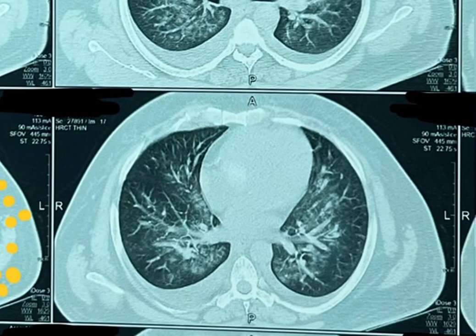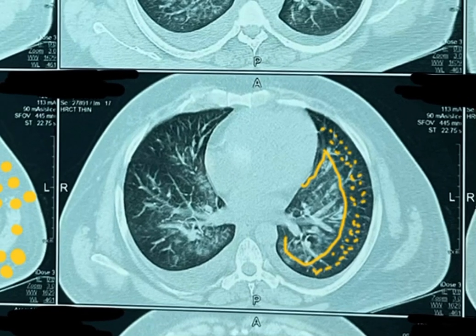Here also, what we can see, compare, we can clearly segregate this area. So this much is much radiolucent, means we can very nicely clearly say air, and there is not much involvement, like there is no infiltration, there is no whitish or hyperdense involvement.